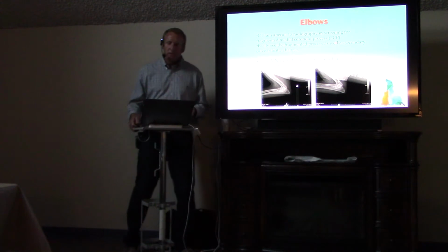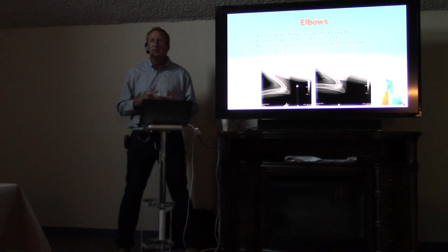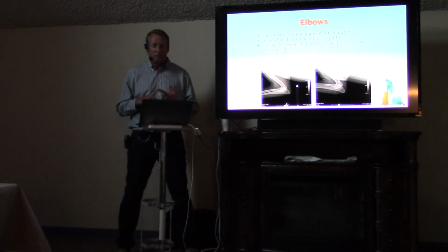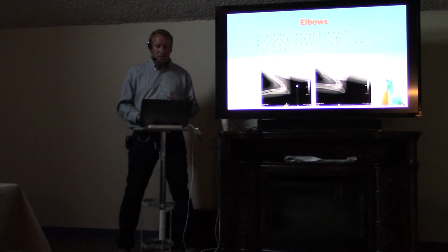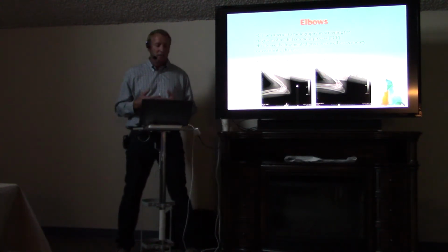CT is great for evaluating the elbows, as far as looking at elbow dysplasia, fragmented medial coronoid process. It can very easily detect the fragments in most instances, and early arthritic changes in the elbows. And this is an example of a 1.5-year-old male neutered lab with a 5-month history of intermittent lameness on the right front limb. Very typical signalment and history for elbow dysplasia.